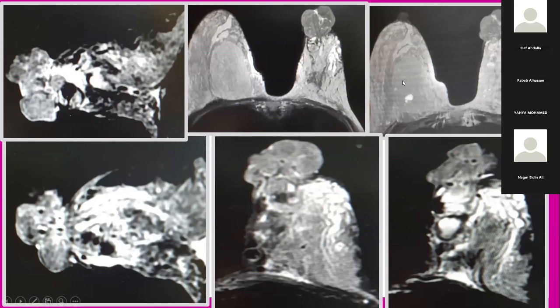And if you compare the two breasts, the left breast is smaller compared to the right breast because some of the breast tissue is extending outside through that defect, reducing the volume of the breast, and there are also bilateral lactational breast changes. I have to note that there is a background inflammatory process in the underlying breast.